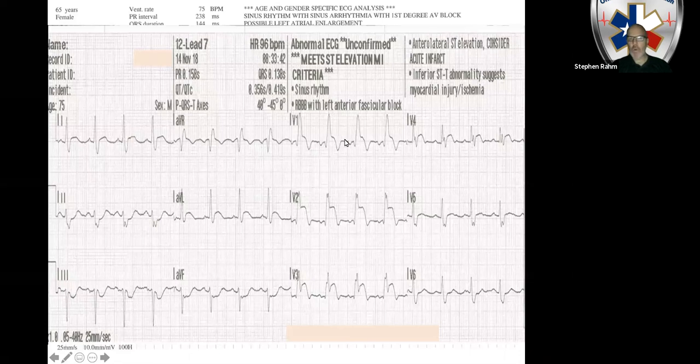So if I put a horizontal line through this entire QRS complex, the first complete triangle I would make is pointed up. So there's your terminal R wave. If we look out here in lead 1 and down here in lead V6, we can see these terminally slurred S waves. But remember, ST depression in leads V1, V2, and V3 is normal for a right bundle branch block, which means no amount of ST elevation should ever be normal for a right bundle branch block.